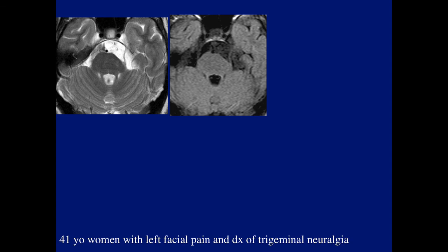Okay, what are we seeing here? Very good. Both Eric and Nate, which side is abnormal? You did not say yet.